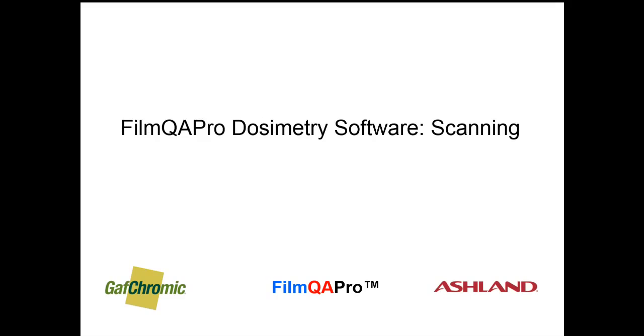This tutorial will show how to use Film QA Pro to scan and collect radiochromic film images. And to do this, it will show scanning of calibration films and correlation of scanner response with dose to establish a calibration function. In this video, I'm using an Epson 10000 XL scanner with a transparency adapter. And while I'll be scanning in transmission mode, everything is applicable to reflection scanning.